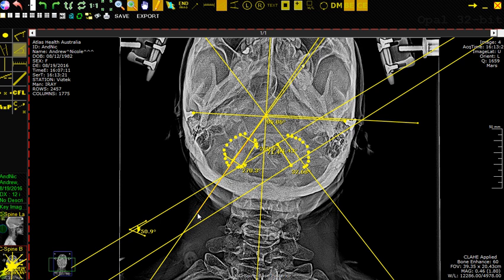I'm going to take it right down the long axis. It could be to here. We could do it to here, but as long as it's along this line, again called the convergence angle, we're just measuring what that is. So that in reference to our line that is perpendicular to the earplug line, in this case 31 degrees, and that is the number that we need to determine.